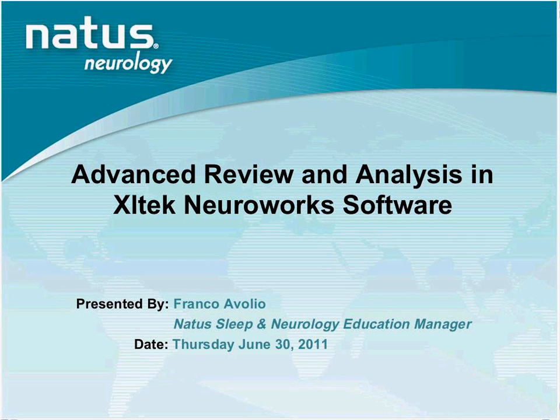I'll end the session with the ICU touch screen option that is available in NeuroWorks. I have a brief video that I want to share with you at the end, which simply demonstrates the touch screen option that is available.